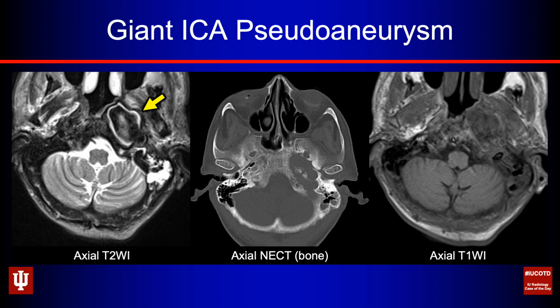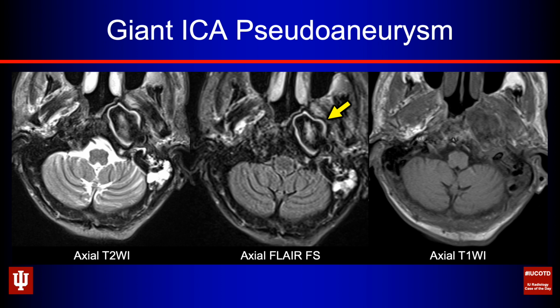Here's our T2 weighted imaging. Whoa, this looks bizarre. So it's largely T2 dark, at least centrally, but man, it's got this very bizarre kind of lamellar appearance to the wall of it, alternating dark and bright lines. That should immediately have the old spidey senses tingling. Same kind of look on the FLAIR imaging. That stuff internally almost looks like a flow void, and that's what it is.